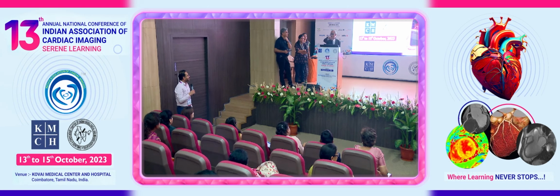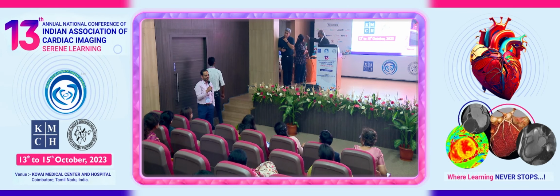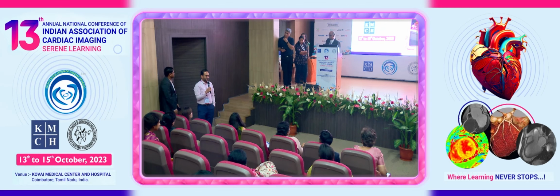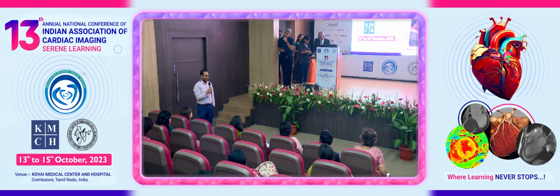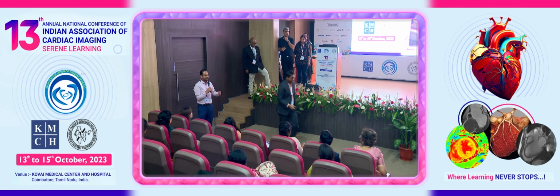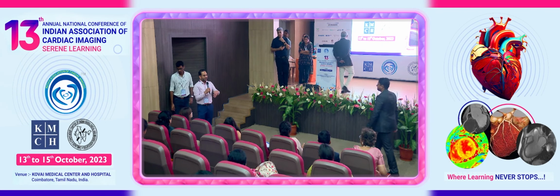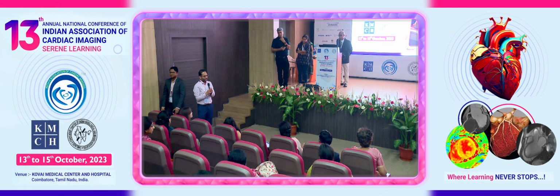Can you give her a mic, please? So the bridging outlook, I think bridging is something that is extremely common. Very common, to the extent that many centers in the United States don't even report it in their reports. It is important, however, to note bridging when somebody is planning to place a CABG graft, because the surgeon will have a hard time trying to find the site for touchdown. So when you are doing a pre-operative assessment for CABG, it is really important to mention that.